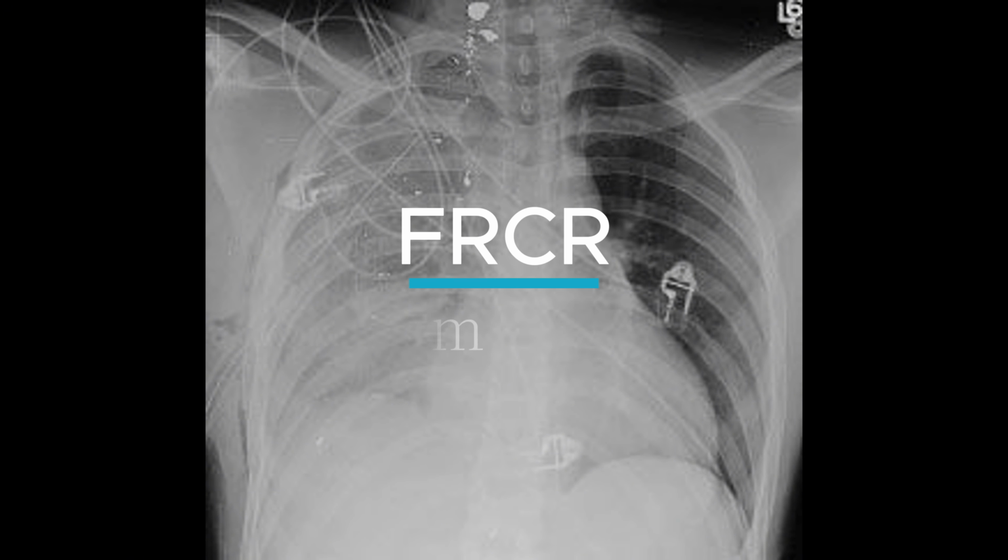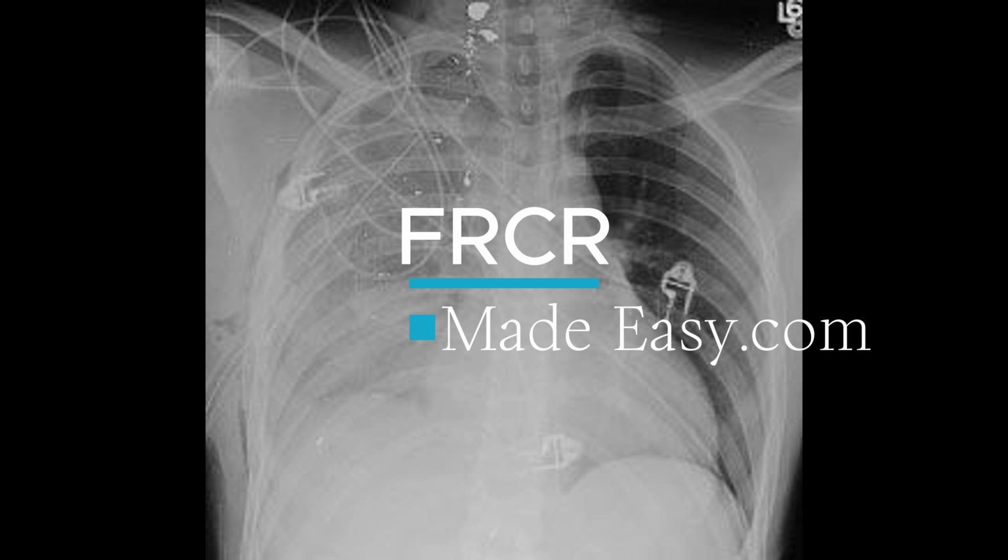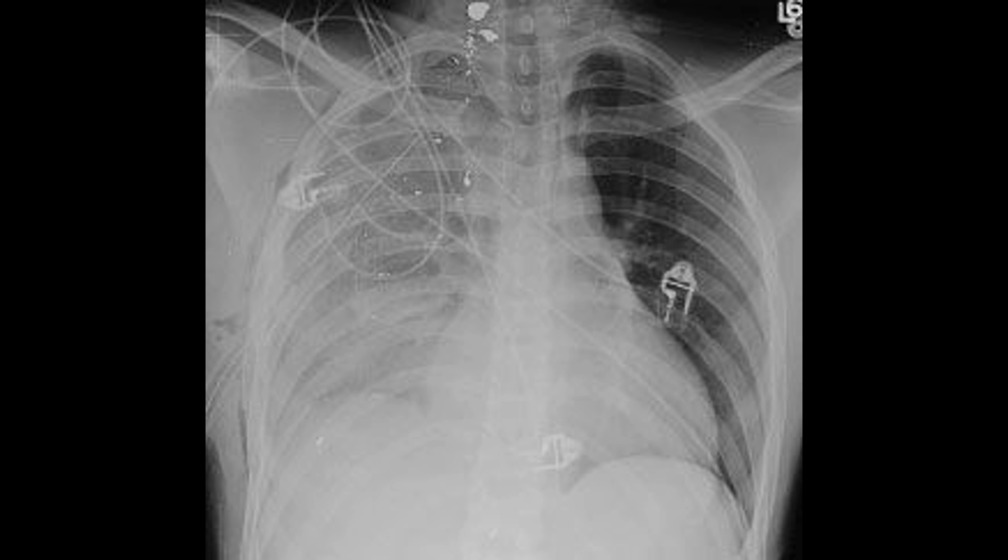This is a life-threatening emergency requiring immediate drainage with a thoracostomy tube. Following drainage, further imaging is obtained to assess re-expansion of the lung and evaluate the extent of injury. The quantity and rate of blood drainage guide further management. If the initial drainage is large or the rate is brisk, surgical thoracotomy may be indicated to control bleeding.